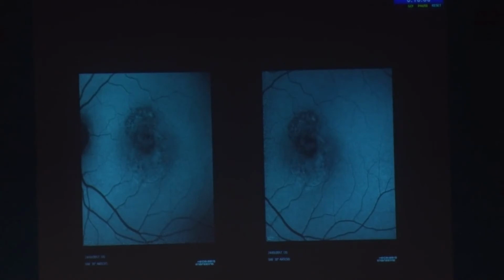So this is the AF, which we haven't touched. Dr. Darayas, would you like to comment about this? Yes. So we can see a lot of mottling of the pigmentation. And normally AF, what they say is the area which is whiter or hyper, it shows more activity of fluid, and the area which is dark, of course, shows the dead RPE. So this means it's quite a chronic kind of lesion. And I think this is important to do along with the multicolor.